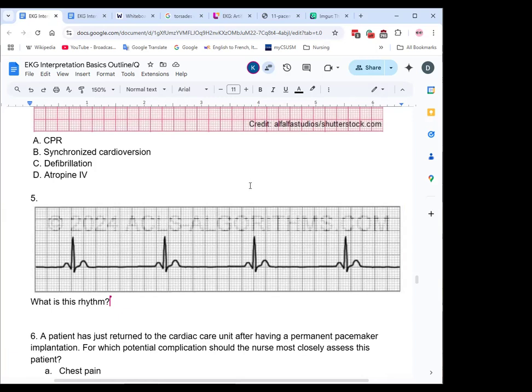Yeah, so this is going to be a sinus brady. We see that the R's are even, or regular. There's a P before each QRS, so it's sinus rhythm. And it is slow. I believe it's a 6-second strip. So 1, 2, 3, 4, 40. So definitely brady. And if it wasn't a 6-second strip, then we can look at our method.